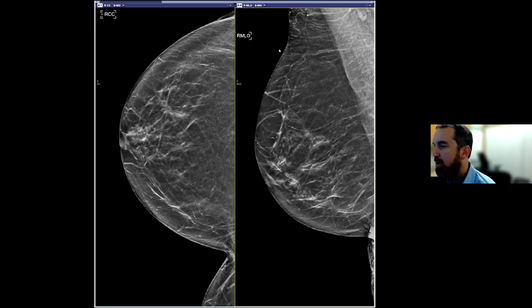In this case, we have a 71-year-old female who's presenting for a screening mammogram. We're showing just images of the right breast currently. And if we look at these SM views in the CC view, lateral aspect, right here, we can see this area that looks like it's potentially an architectural distortion, right? See some spiculated lines, central component here, more spiculated lines, sort of that pulled in type of appearance. And we see here, we expect this to be in the lateral aspect of the breast, approximately middle depth.